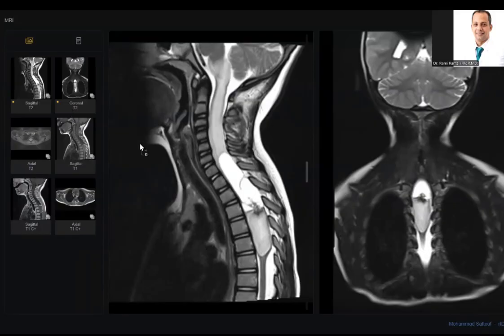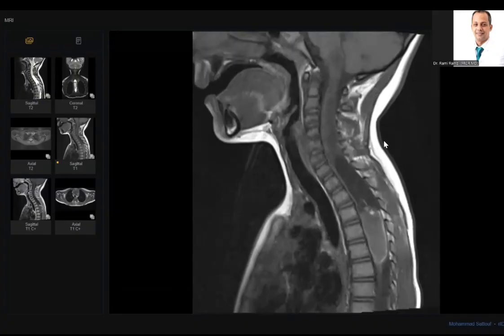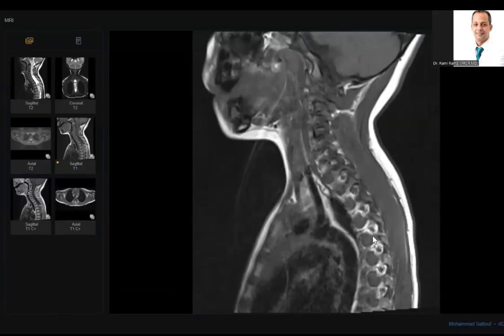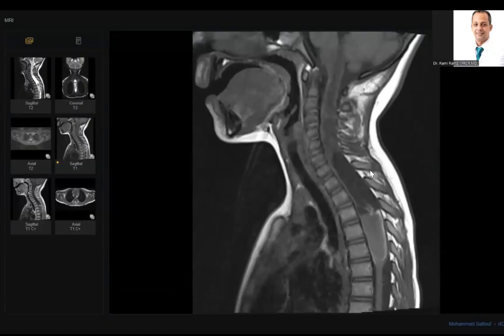Again, my colleagues, this case delineates the importance of conventional signs. Since two sessions ago, I have been bringing cases that highlight the importance of T1. All of you must have a look at T1. It is impossible to miss all of this bright signal. You should talk about it. Even, doctor, this is maybe a fat containing lesion like teratoma. Like this, it will be good.